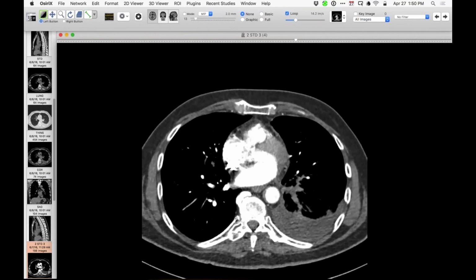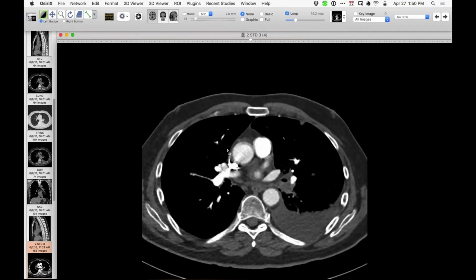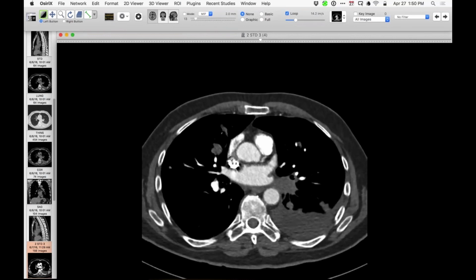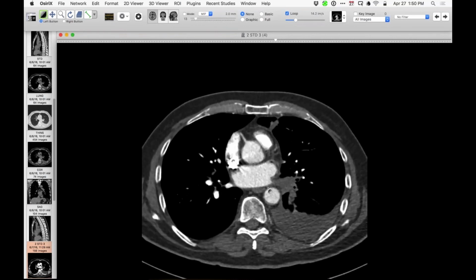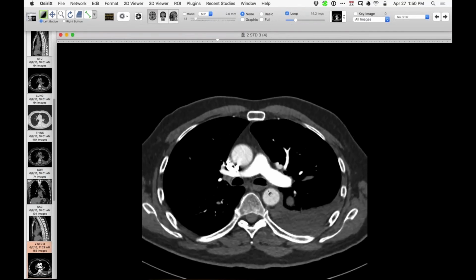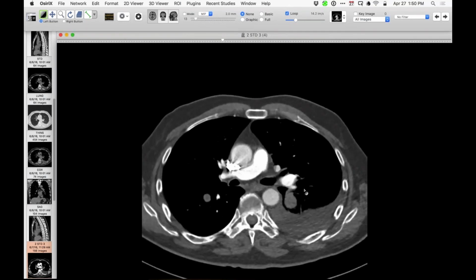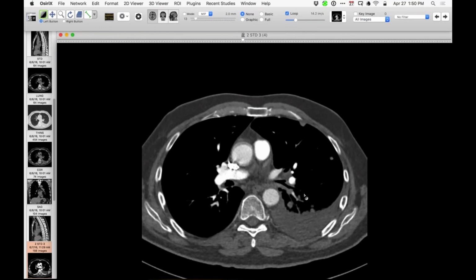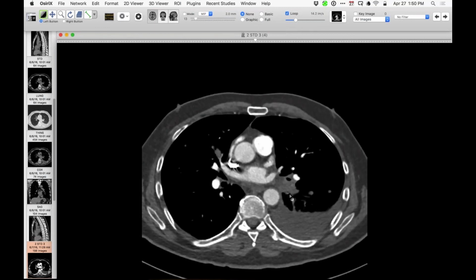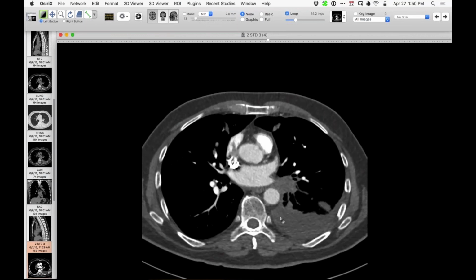And then as we scroll up, I will show you that there are two reasons to have substantial ischemia. If we go to the left pulmonary vein here, inferior, we don't see it, but we see this instead. And then if we go from above down and look for pulmonary artery inflow, we see it there, we see some lingula, but beyond about here, we don't see anything. So this is tumor, presumed to be tumor.